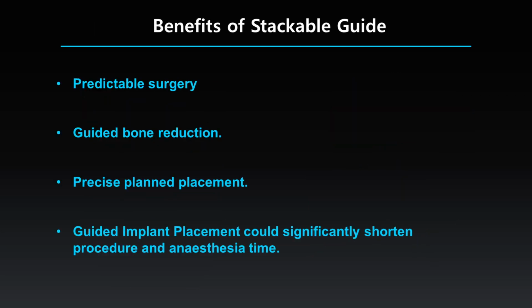Benefits of stackable guide. Predictable surgery is an uncomplicated and highly methodical approach to guided surgery. Guided bone reduction. Prosthetically driven plan ensures ideal guided bone reduction to accurately transfer the simulated plan to the patient. The use of a bone reduction guide during surgery eliminates the arbitrary removal of osseous structure and helps ensure the mandibular crest is reduced in prescribed dimensions, eliminating only the sharp edge of the knife ridge.